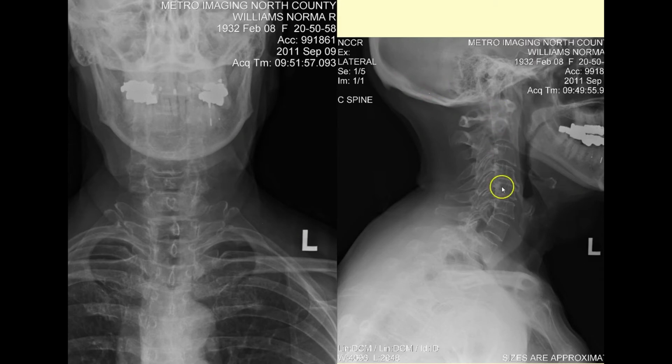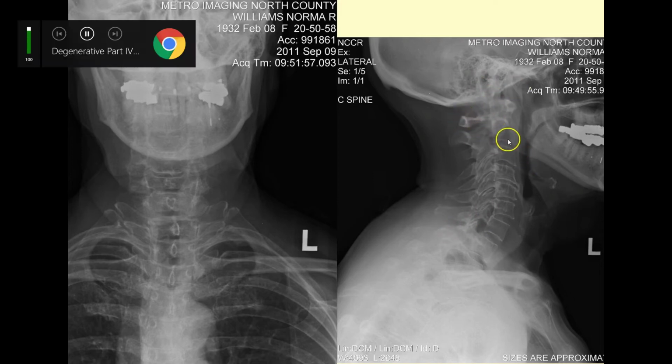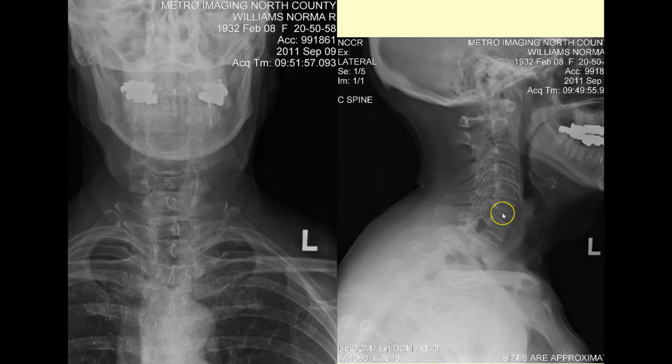So we can see, a quick look. The bodies are here, the spinal column is here, posterior spinous processes are here. Again, work your way around each and every cortical margin, and it'll take you some time. It'll get quicker and quicker. It'll eventually take you longer to move the mouse around the image than it will actually move your eye around the image.